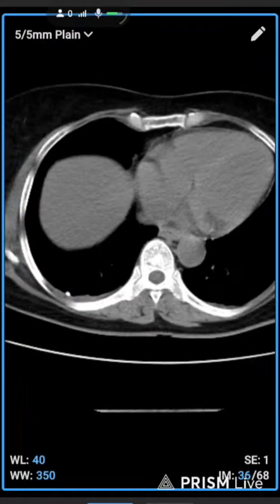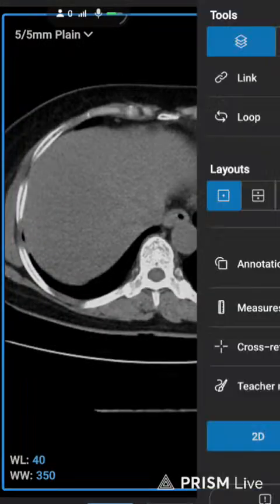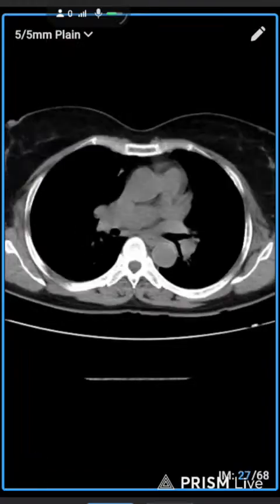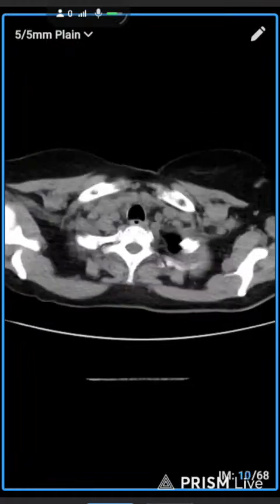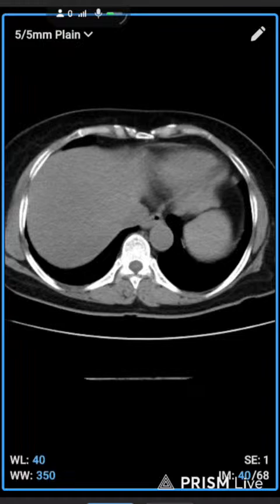It appears with some type of shortness of breath, SOB, shortness of breath. Here you can see one more calcification in this area. So it means there was some type of infection 6 months or 1 year ago, or it's dissolved.